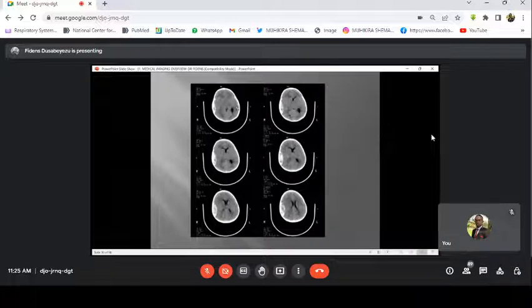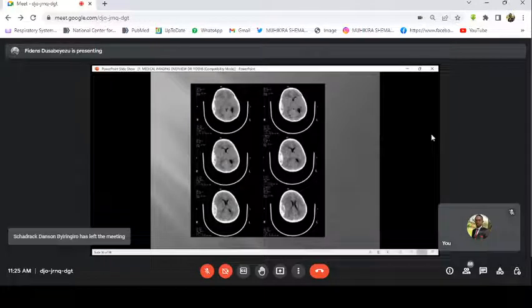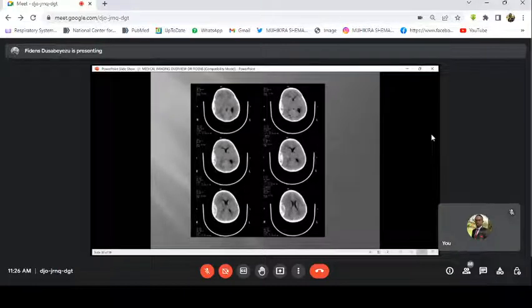And from these images, you can see the brain and the ventricles because of the fluid. On CT scan, fluid is dark. On conventional radiography, fluid is white. That's very important, by the way. Other densities are the same. But for fluid, on CT scan fluid is dark. On conventional radiography fluid is white. Okay.